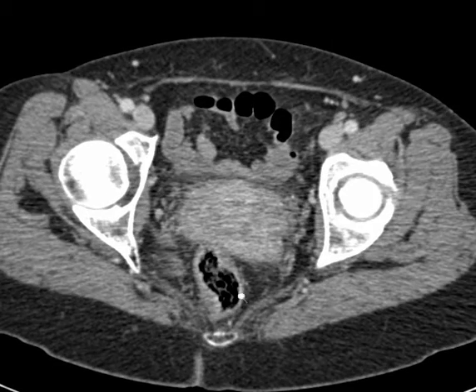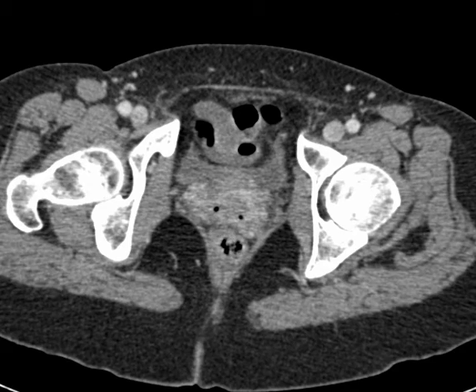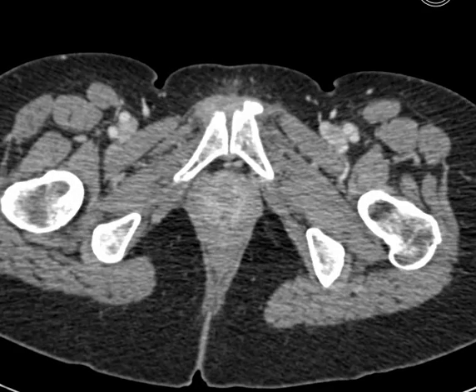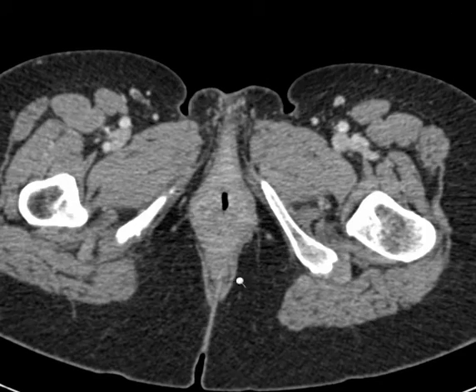So now we're into the rectum. Again, for reference, here's the uterus. Here's the hips, so right hip, left hip. Okay, then all the way down, so the lower portion of the rectum, which then ends in the anus. So we're now into the anal canal. Okay, and this is about as inferior as we go. So the anal canal ends right about here. For reference, here is vagina.